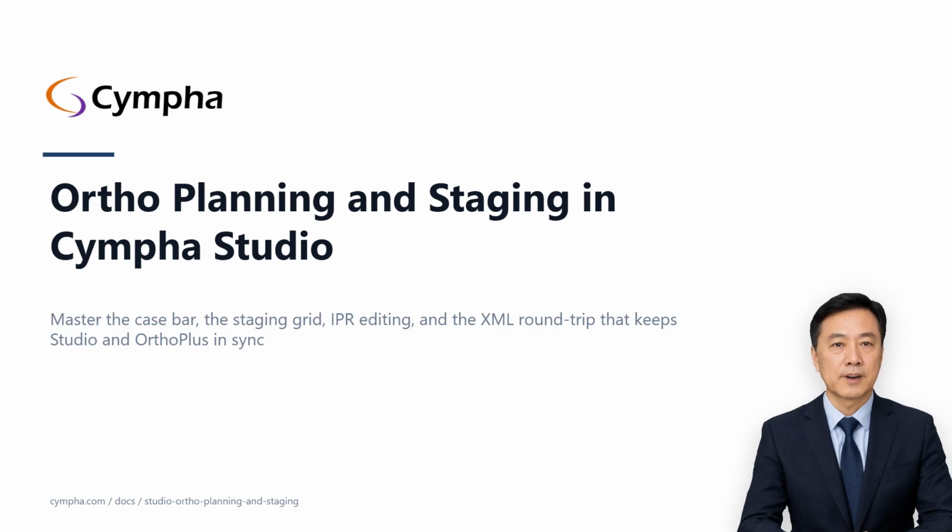By the end you'll know how to navigate a treatment plan step by step, open the movement chart and restage a tooth's movement, toggle and edit IPR clearance, push fine adjustments with the tooth movement panel, and round-trip the case XML between Studio and Ortho Plus.